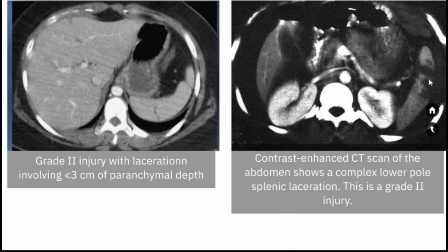So these figures are all bad quality, but I extracted them from Medscape, from radio. You know why it's bad quality? Yes, because these patients are irritable and they are not cooperative. They are breathing, they are moving, they are in pain, so there's a lot of motion artifacts. So it's not the image, it's the patient. Okay, yes, that's a good reason.